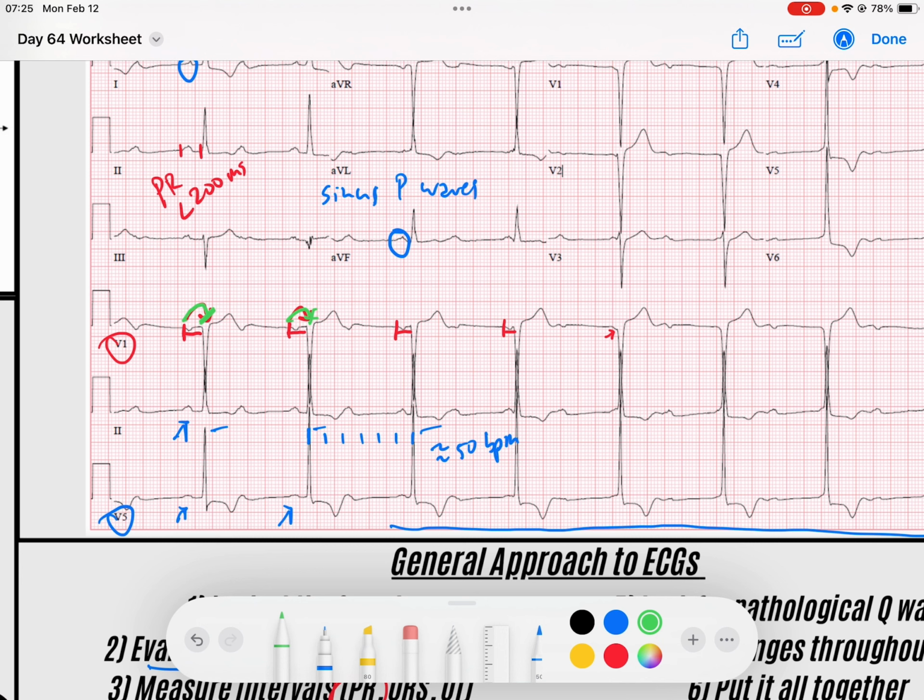And if you look closer, what I notice at least is that I've got this P wave here, but I've got a little squiggly right there, and then I've got my little P wave here, and then another squiggly right there. And then it looks like at the beginning of this QRS there's a little P wave hump right there. You can see it just peeking out. And then you've got another P wave. And then the next P wave is probably buried in this QRS. You could actually see it in the QRS above right there.